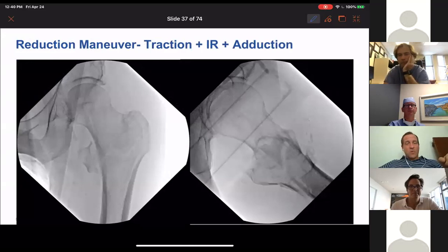But when you go to a true proximal femur lateral that doesn't account for the anteversion of the neck, it's just amazing how this lateral view, which looks everything you said, lined up, posterior cortex flat to the floor, you'll see something way off on the medial side. And so there are some fragments on the medial side that seem to be not moving with traction either. And it's amazing how different it can look with a little bit different rotation of the beam.